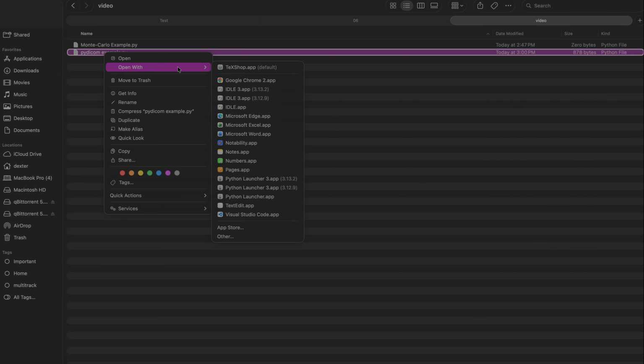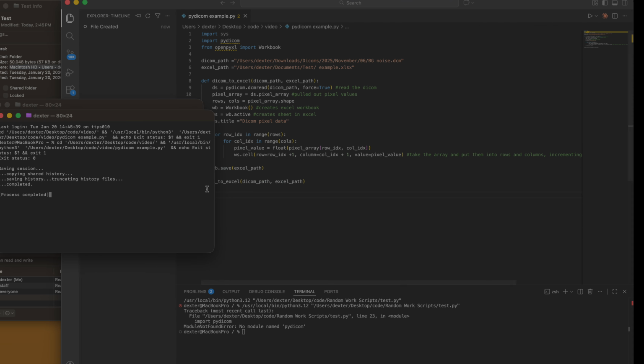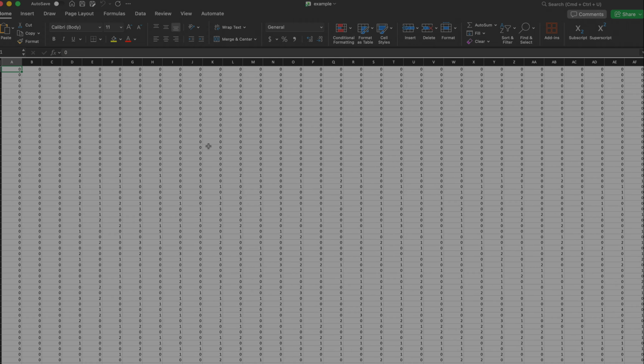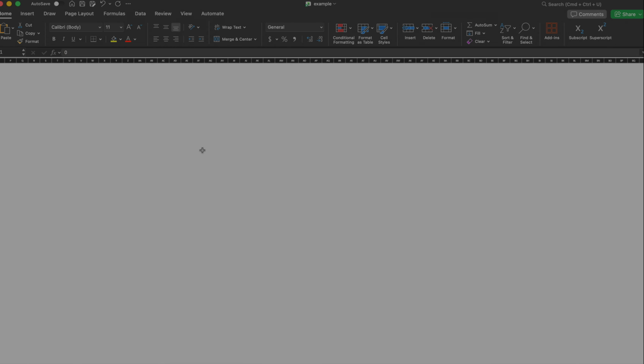So let's go. Let's open it with Python. It says saved. So now let's go in our test. There's something saved, so that's a good sign. Now let's open it up. Okay, so we see a bunch of ones and zeros, ones and zeros, and then some numbers. If you're used to looking at medical imaging, it's not going to be in ones and zeros.